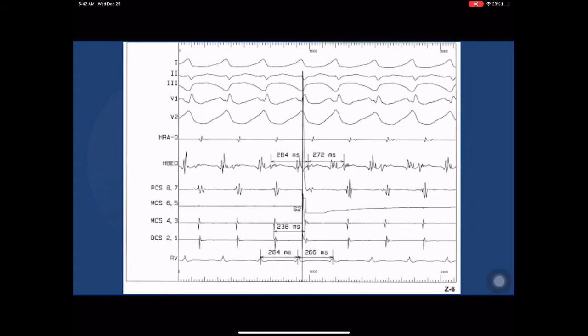And I'll go through why that is in a moment on a schematic. But you can see that here is your atrial activity, and we're at a point before we've disturbed that. So this one is not affecting the His bundle A. This premature atrial beat actually brings in the ventricular beat. And you can see now 284 has become 266. And very importantly, the QRS complex is not changed at all during this premature beat.